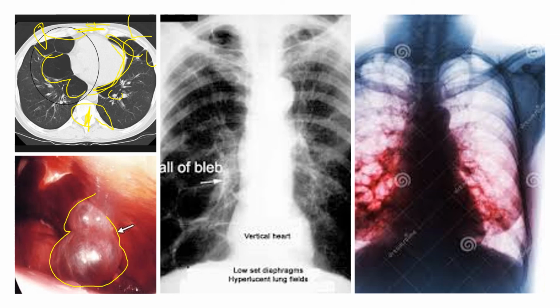So on an x-ray, that's why I put the x-ray here, you can see all these bubbles, all these blebs. So this means you put this patient on a ventilator, just be careful, because what happens if you put too much pressure on a weak tissue, right? It can make it worse, and so that's what we're looking at here. You just don't want to exacerbate that, because when you burst one of these, then it's called a pneumothorax, right? So I've taken care of and vented some of these patients, and you just got to be gentle with the ventilation numbers that we're using.